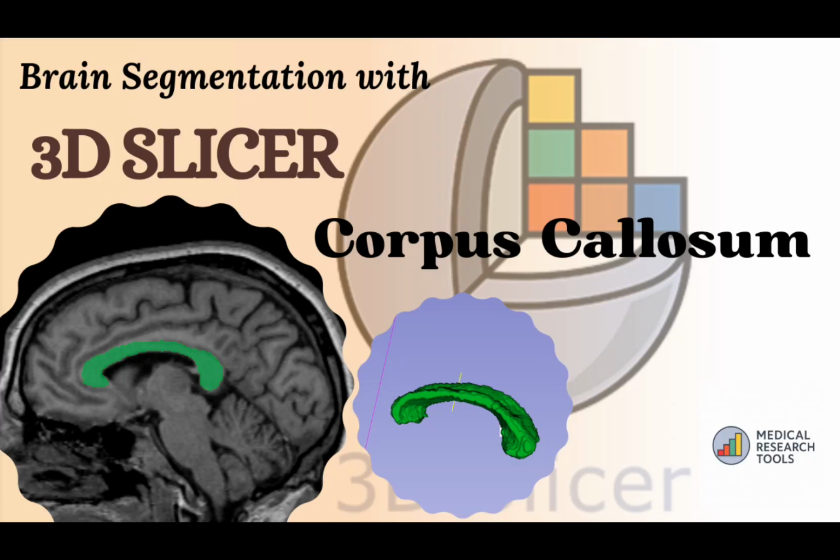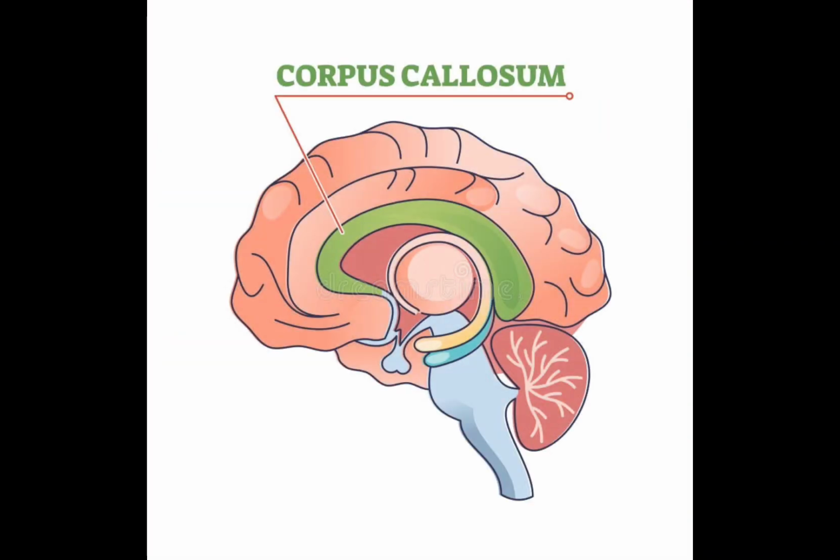Hello, welcome to a tutorial of brain segmentation with 3D Slicer on medical research tools. In this one, we are going to segment the corpus callosum. The corpus callosum is the largest white matter structure in the brain connecting the left and right cerebral hemispheres.